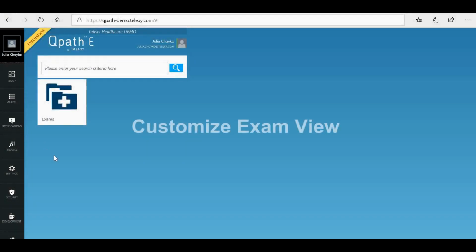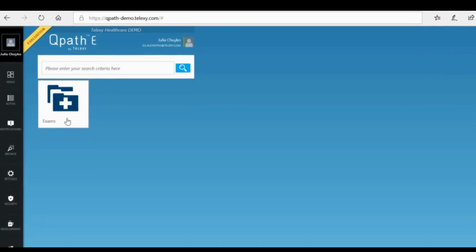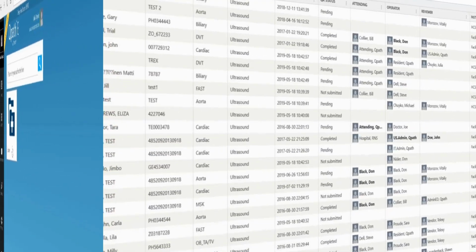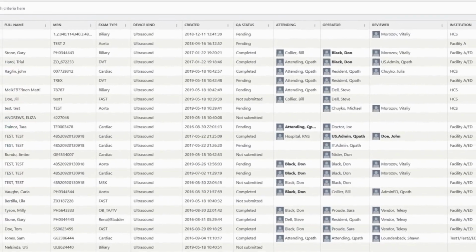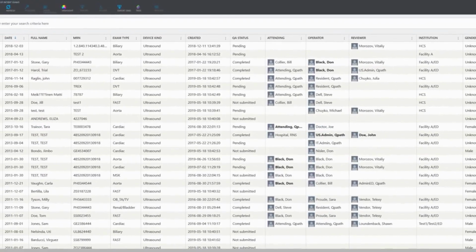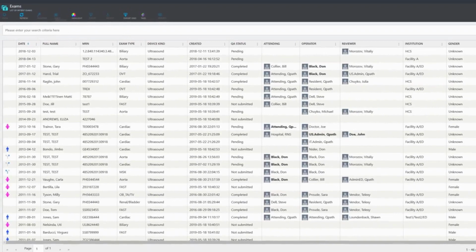You are watching Qpath E demo. In this video, we will talk about the exams view and its customization options. The exams view is the list of the exam records with ultrasound images, patient, and physician information.